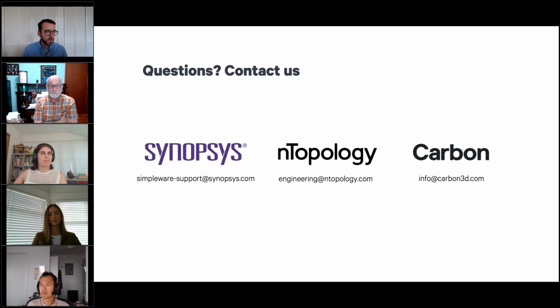Can Synopsys work with MRI data as well as what you've shown us here? Absolutely. Here we've focused on a knee CT, a cutting guide that was designed from knee CT image data, but we also have an auto segmenter for knee MRI data. If you have another anatomy that you're interested in designing a device for, it's probably best to initially check out our website, and then get in touch with us if you want to know more about automatic segmentation. We can also use the standard platform to offer manual or semi-manual segmentation.